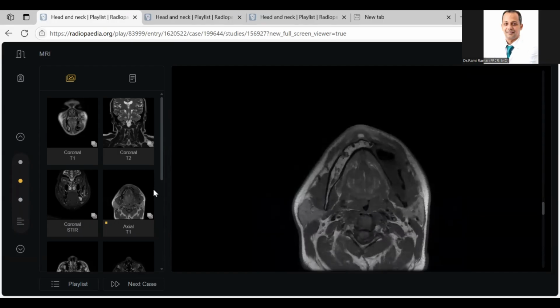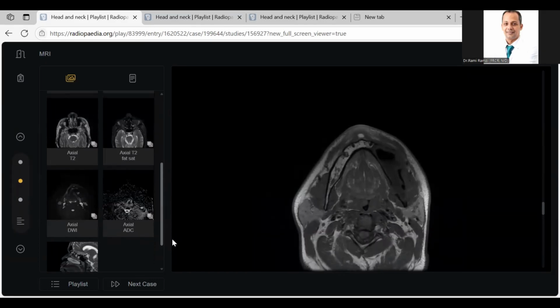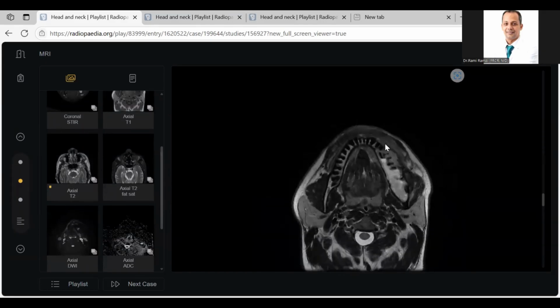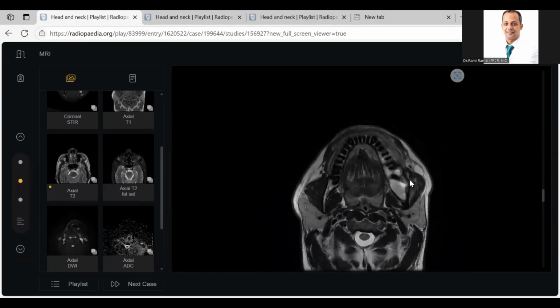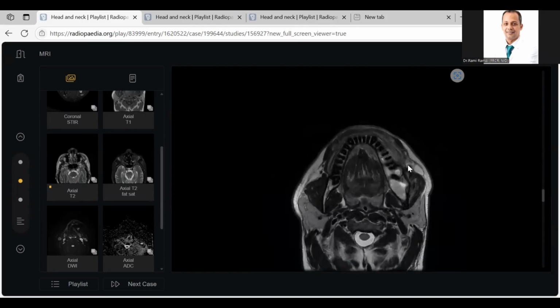See here in the MRI, this is not infection. Not infection at all. See here, this is a lytic cystic lesion. If this were infection, you couldn't see tissue like this; you would see extensive edema. Anyway, you did very well. It is also a difficult case.